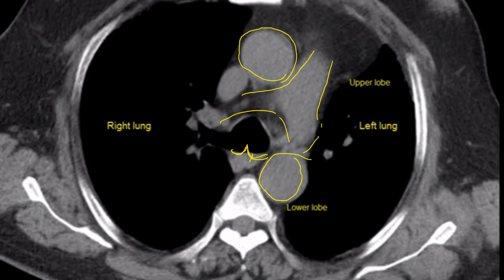If you rewind it a little bit, that's where we're separating. We're getting to the point of the carina where we'll separate into the right mainstem bronchus and then down into the left mainstem bronchus. That's what you're seeing here. Here, do you see the fissure? No, it's harder to show up because the density value is a little bit different. But hopefully you can start to see some of these things appear.